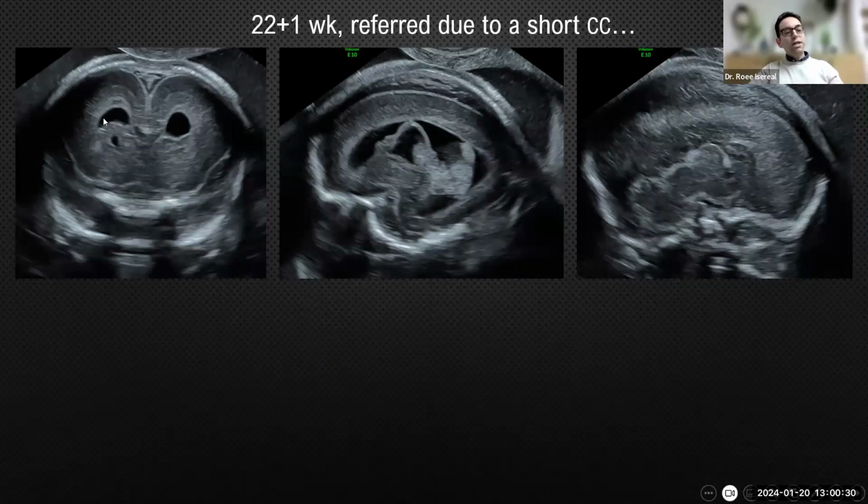And you can see this echogenic rim around the ventricle, which should not be here. At this stage, you should only see the subplate and the intermediate zone and their interfining line. But here you have a three-layer appearance, which is a completely pathological lamination. You look on the parasagittal images, you can see the cavitation and the uplifted ganglionic eminence bulging into the lateral ventricles. You see the parenchyma is small. There's a lot of fluid surrounding the brain, and this echogenic, abnormal lamination that surrounds the brain. And when you're looking for the corpus callosum, it's there, but it's very small and dysgenetic.